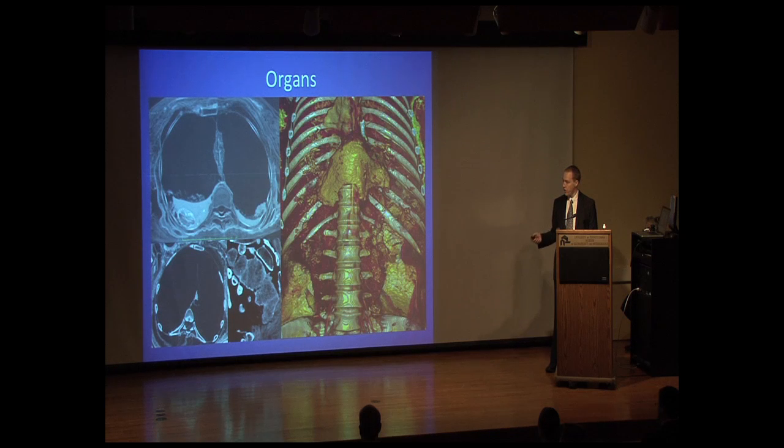The pericardium itself appears as a linear opacity, tethered between the sternum, thoracic spine, and diaphragm. The liver appears as a dense mass, reduced in size, but retaining its shape.